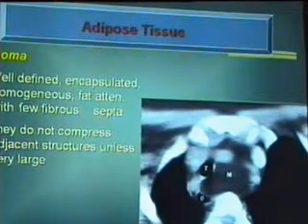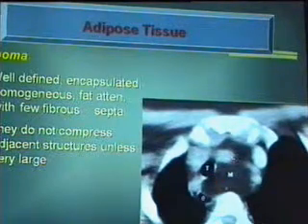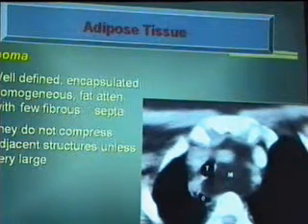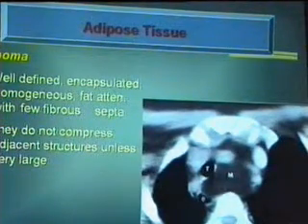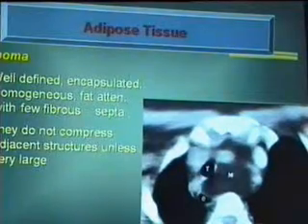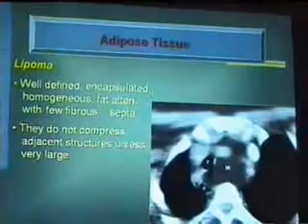We know that the trachea is normally shifted to the right. Okay? It is slightly displacing the trachea, maybe because it is a bit larger in size. So lipomas, like cysts, are things of soft consistency, and they hardly make a prominent mass effect. Okay?